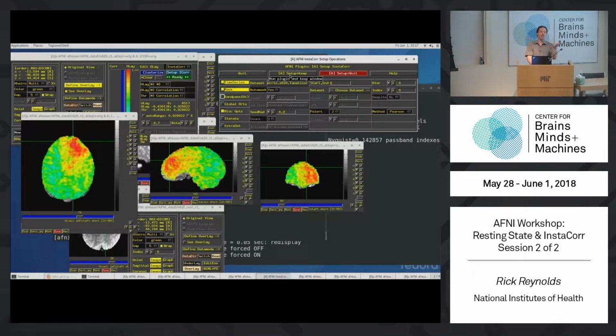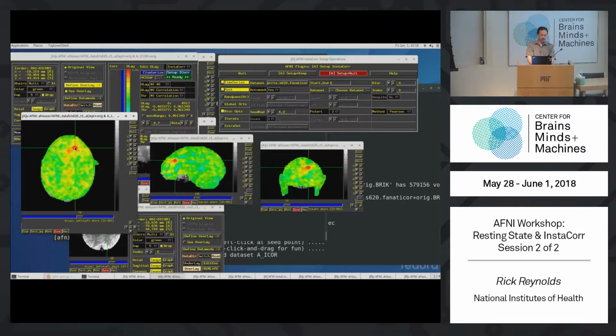So now we've basically taken off all the pre-processing, except for we're still going to use the 4.2 millimeter seed radius. So let's hit setup and keep, and the controller, boom, now it's ready. Now you've got the green ready up here. So now if we hold the control shift, well, we could just right click, but now look at it. Now it looks more normal, and you see it's left-right symmetric now. This is the exact same area that had the horrible problem, but it looks more like what it should look.